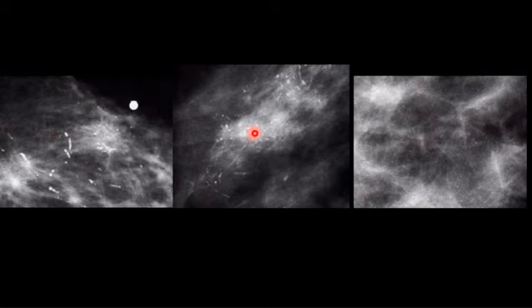Here it's more in a regional form, and here it's more tiny calcifications. Just a word of advice, if you see this kind of calcification, check one thing, be sure of it. Be sure that your mammogram cassette is clean.